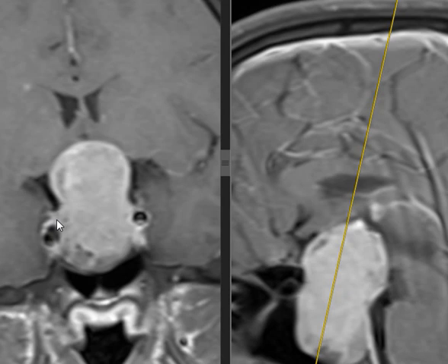Look, you have to say it. It's the nausea, vomiting, diarrhea of radiology. With pharmacology, they have nausea, vomiting, diarrhea. But radiology, we have... Come on. Could it be a meningioma? It's extra-axial, it's enhancing, it's compressing. Possible, but it is not. We all know this is a macroadenoma, but we want to list the differentials. What else? Two more.